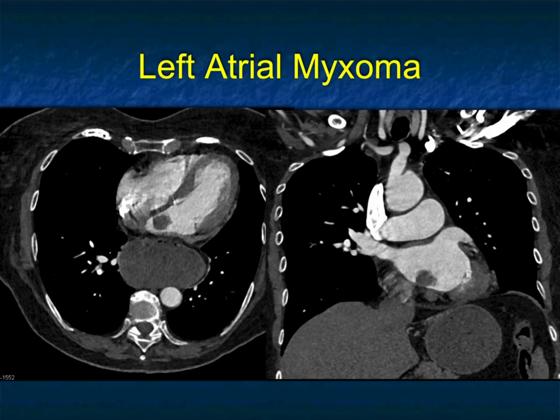Here's another case where the patient had chest pain, and I think the chest pain was related to this very large hiatal hernia.